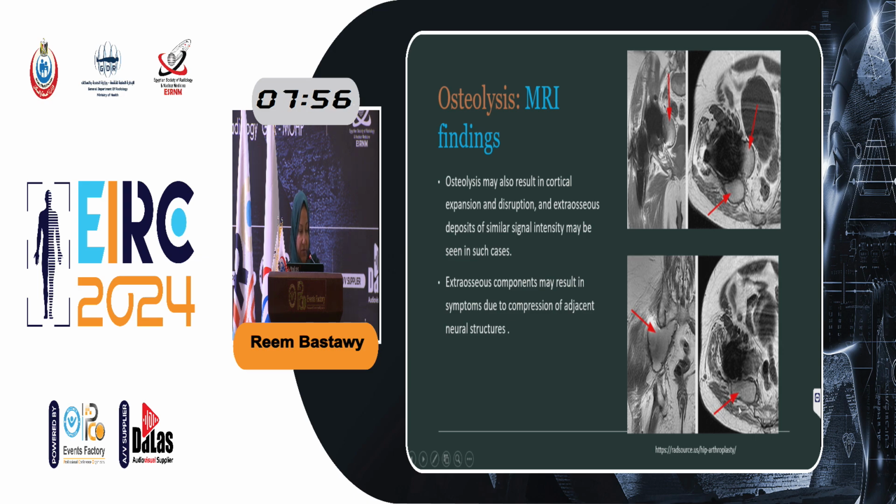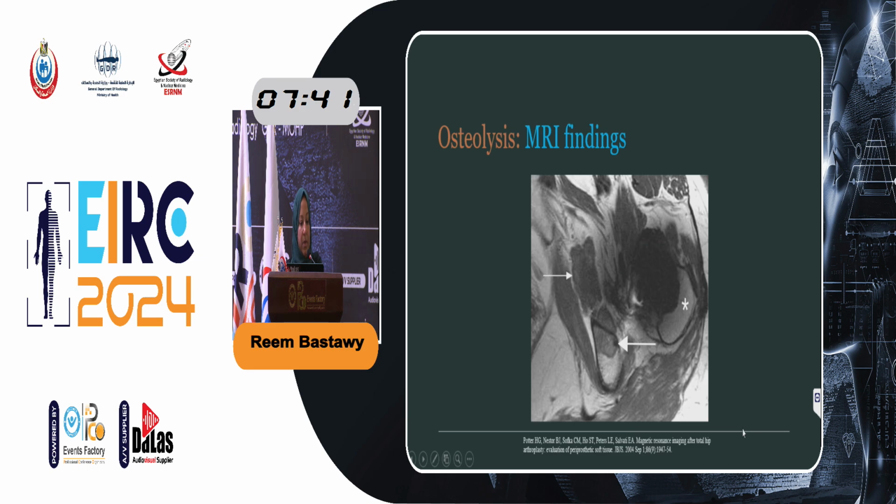This is a case from the literature. It's not my case, of course, but this was a case of a 67-year-old male presenting with foot drop due to compression of the sciatic nerve by this extra-osseous component of the osteolysis. Another example demonstrating the signal intensity of the bony lesion and the extra-osseous component, the intermediate signal intensity with the characteristic hypointense rim.